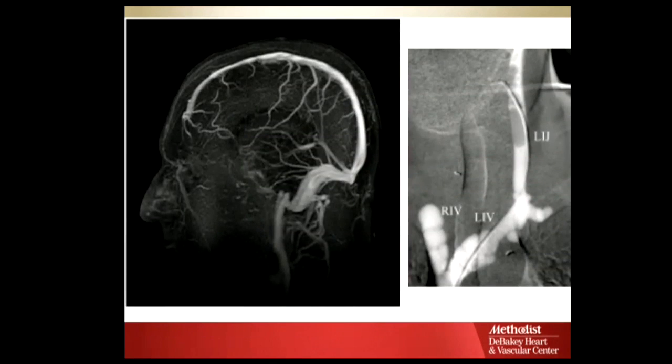So looking at this, it's the drainage pathway. Okay, so what's that? Superior sagittal sinus. What's that? Straight sinus. Straight sinus drains into which transverse sinus? Usually the left. I was always told straight left. That's how you remember it. Superior sagittal sinus usually goes right. Sometimes there's a confluence of the sinuses. Basically, oh, here, what's that? Two of them superimposed.